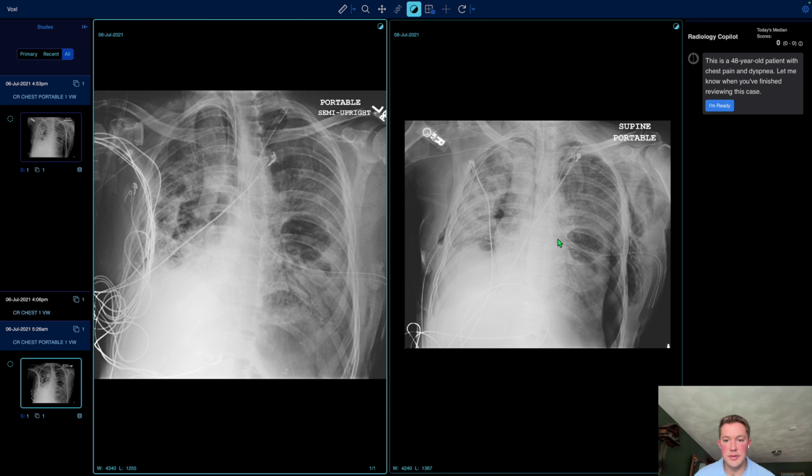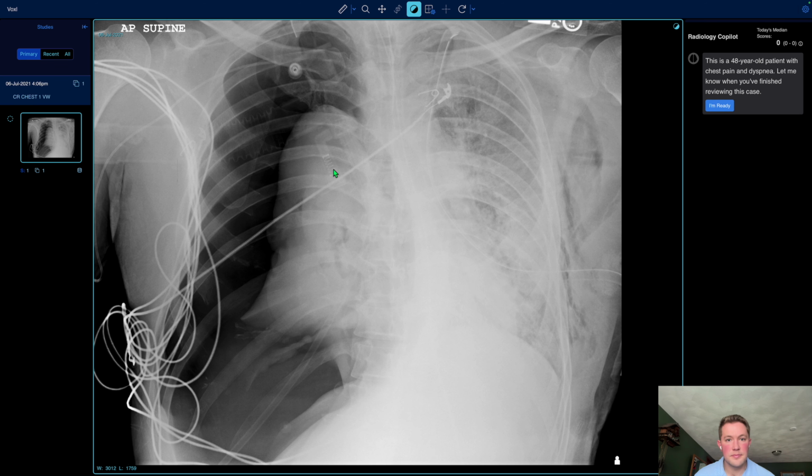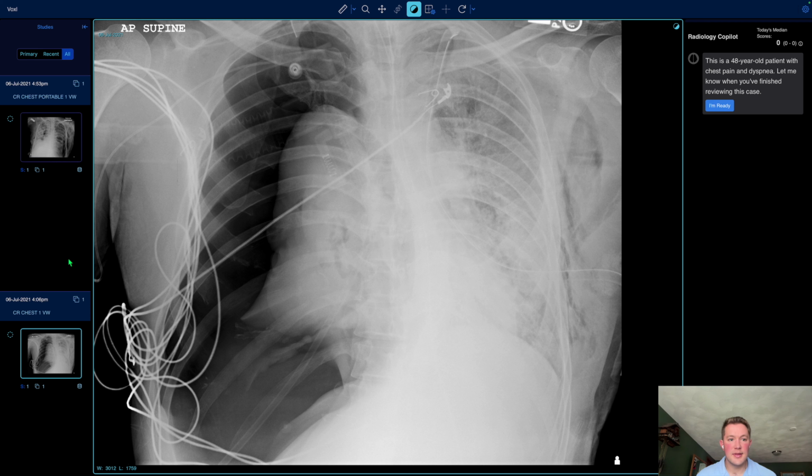So overall, great work. You started out with this primary study, and you took that apart, and then we went into the patient jacket, looked at the prior and future films to really put a story together on what happened to this patient on that particular day. Nice job, Matt. Thank you.